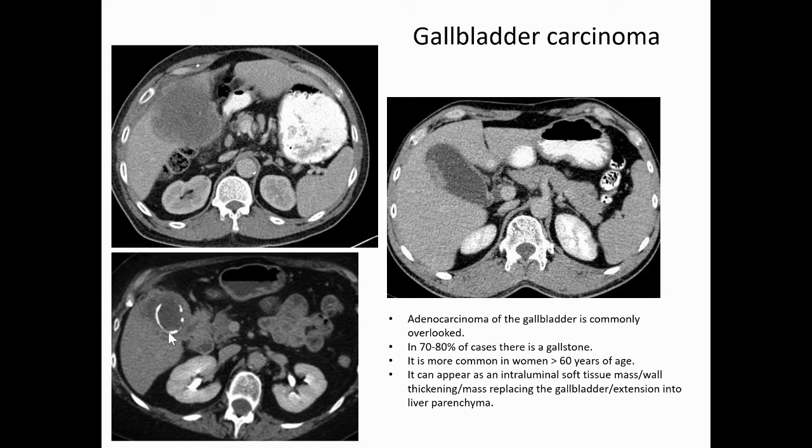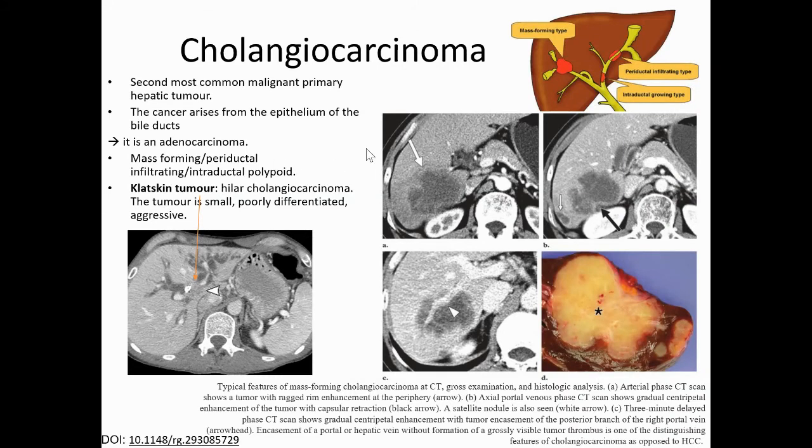It's quite a heavy type of calcification, and it's a predisposing factor for gallbladder carcinoma. Or sometimes we can catch it at a very early stage when it's only visible as a polypoid lesion that's protruding into the lumen of the gallbladder.